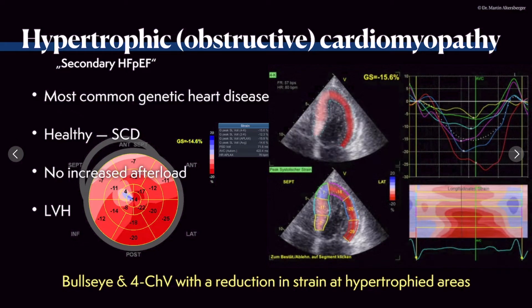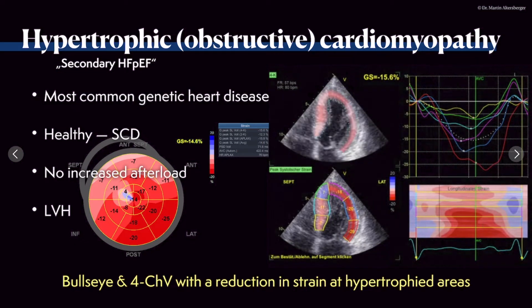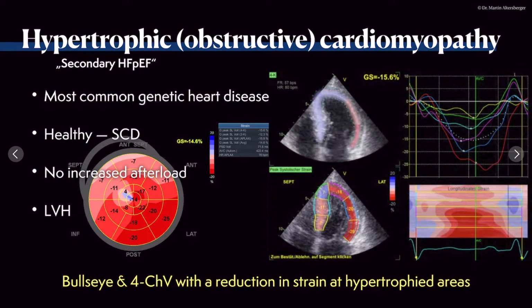We can see here this quite interesting phenomenon. Again, here the machine thinks that this, due to this hypertrophy, is even a dyskinetic motion of the heart, which in fact is simply this hypokinetic longitudinal function of the ventricle with this severe hypertrophy.